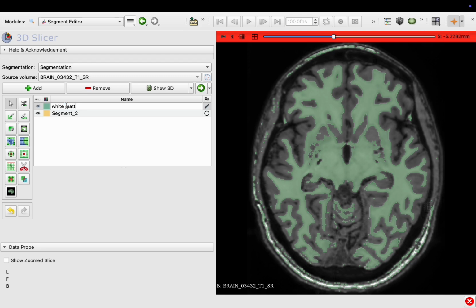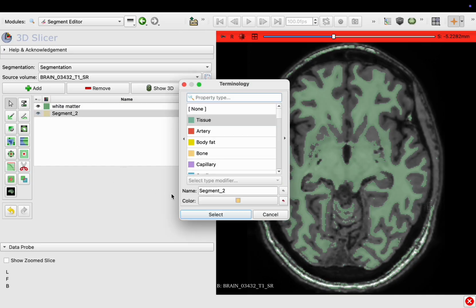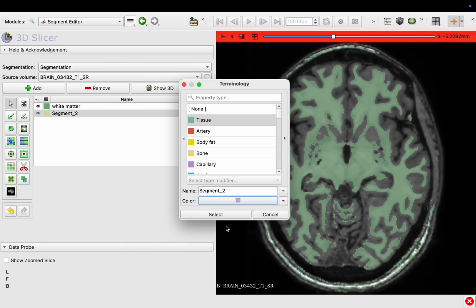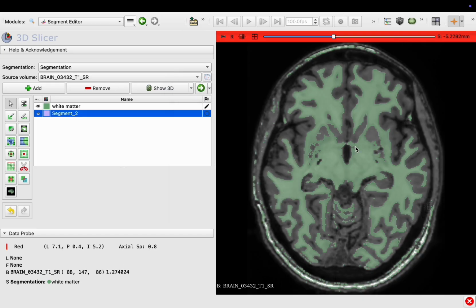Now I add another segment. It's better to rename your segments. The new segment is gonna be our cerebrum.